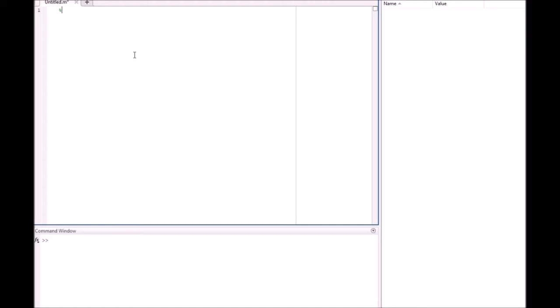Normally I start off by putting a title at the top. So, something like: this script tests the feasibility of importing raw ECG, or EKG, let's go with both, EKG, it depends on which one you're used to saying, tracing data into Matlab.